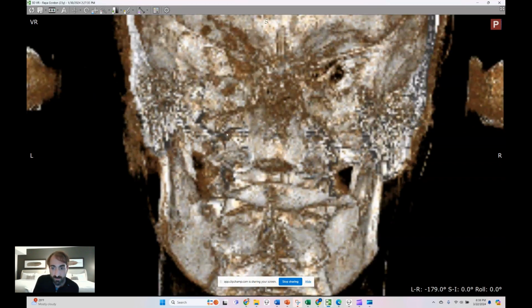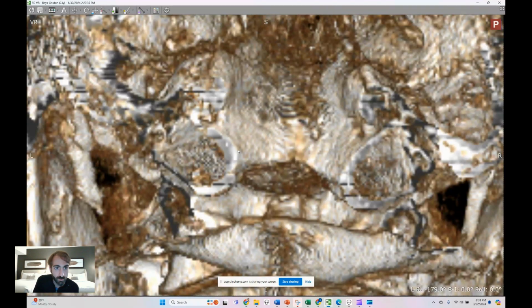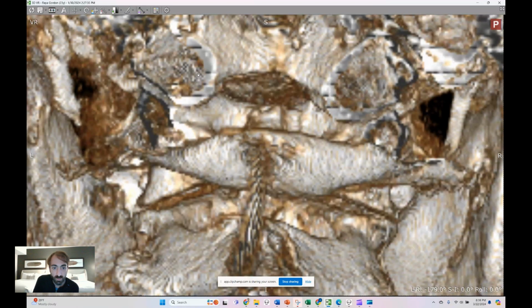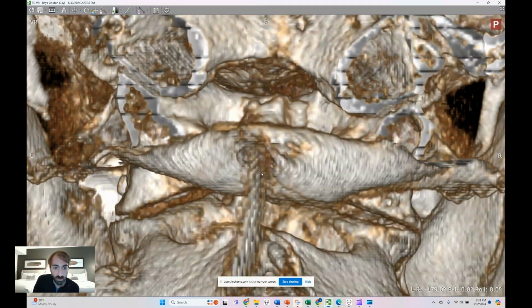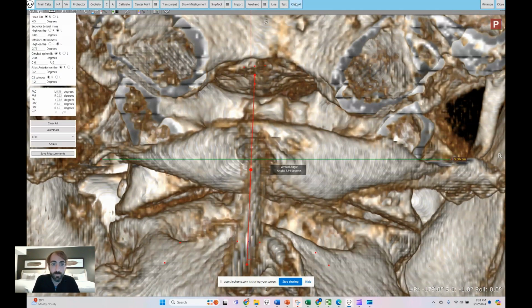I got my cut just right. We should see right in that C joint. Beautiful. And then let's get our SI right for that C2. That looks great to me. Draw a line for reference. And toolkit. Clear all. Calibrate.